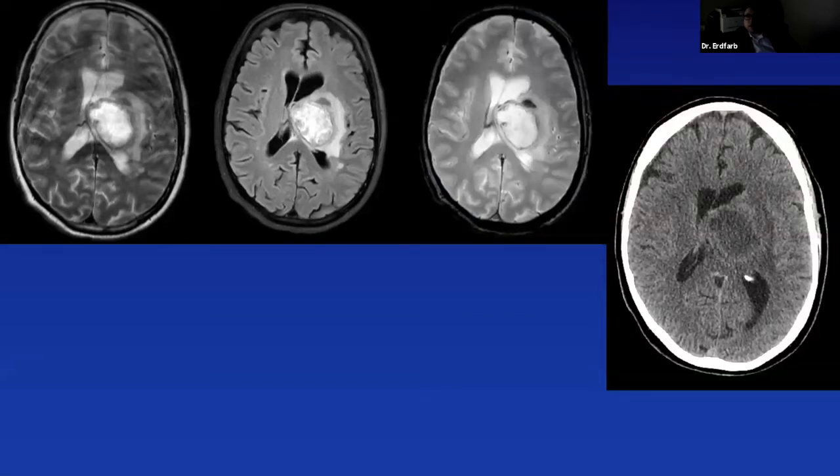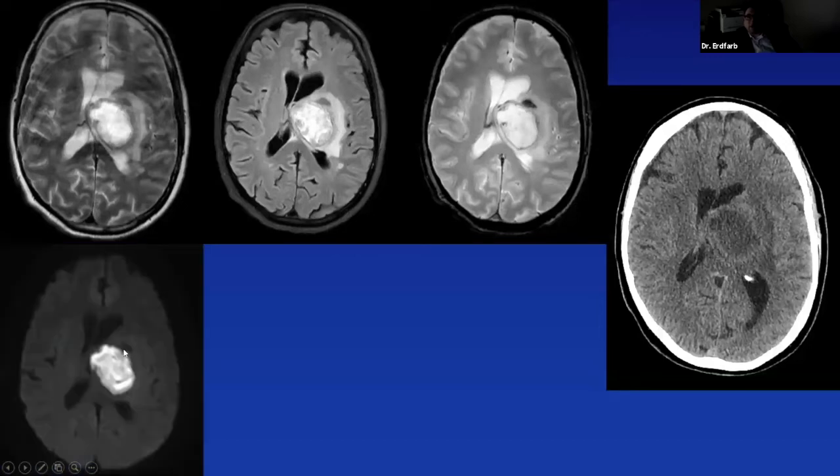You get your gradient or your susceptibility weighted imaging, whatever you use, and you see there's some inhomogeneity of the magnetic field, whether it's debris, calcification, or blood, but again, not simple at all. And then again, your kicker, it's your diffusion, and like we talked about with the epidermoid cysts, you have a lot of restricted diffusion here, right? Restricted diffusion, in common parlance, certainly in our ERs, they think, oh, restricted diffusion, that means a stroke. We haven't talked about stroke at all today, and we won't, but we've already seen epidermoids have restricted diffusion. Here's another intracranial cystic lesion that has restricted diffusion.